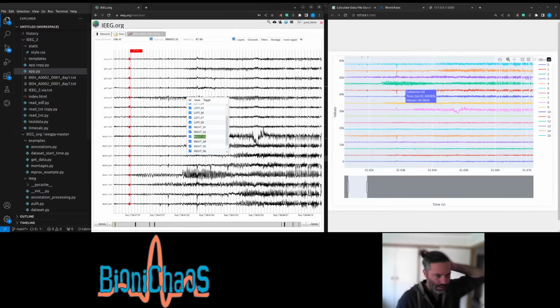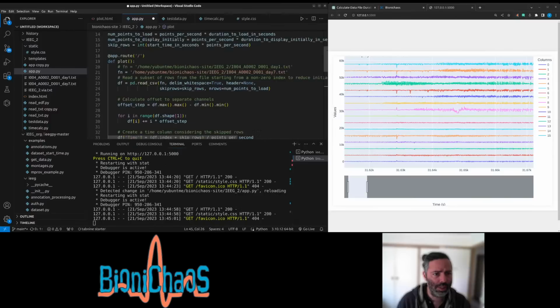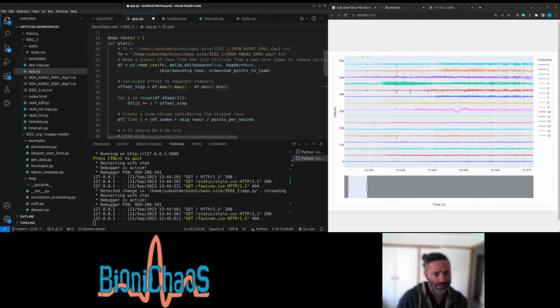Now the other thing is, this actually indicates that the rate is not 400, but this weird number, which over time might make quite a bit of difference.